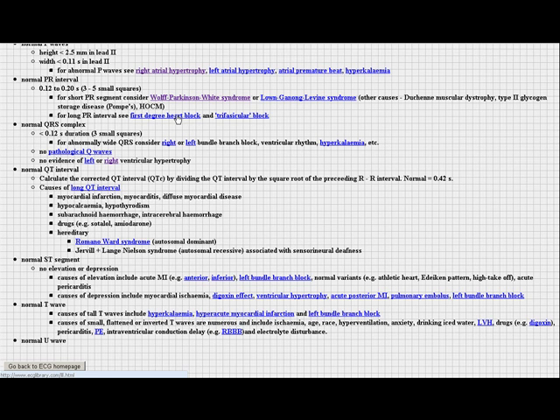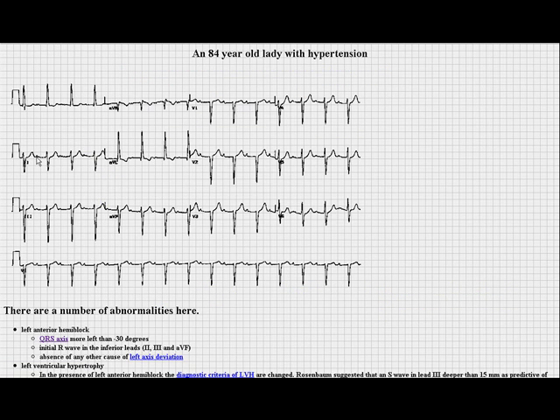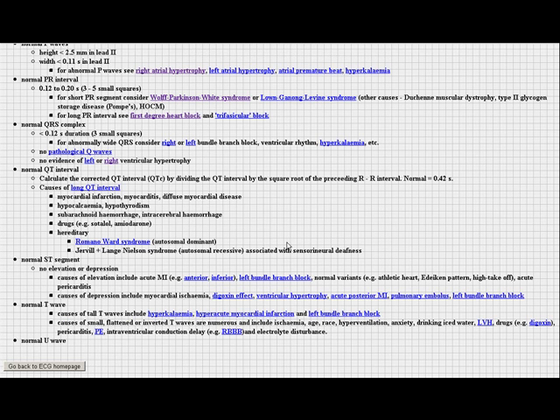There's 3 different versions of heart block. There's called 1st degree, 2nd degree, and 3rd degree. Let's look here in lead 2, and you can see that this is a QRST, and the P wave is right here. There's a long delay between the P wave and the QRS, and that would suggest a very long PR interval. Second degree block, I don't think there's examples of this, but second degree block means it's continually extending and occasionally there's a P wave without a following QRS. Third degree block means there's complete separation between the P wave and the QRS. There's a complete lack of communication between the atria and the ventricles via the AV node, so there's a complete block.